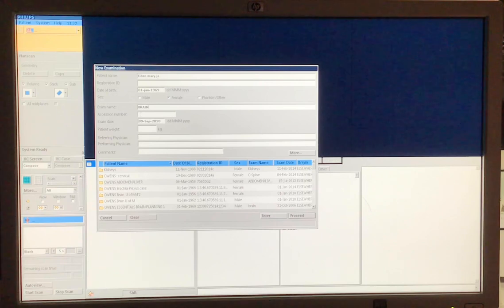The accession number will be the accession number that's tied to your exam. So again, in the real world, that will populate for you, so don't worry about that. It'll have today's date and the weight that you put in, where you're going to look at this chart. And the Phillips has it in kilograms, so therefore you're going to look at the kilograms and of course are the pounds, and you're going to correspond it to the kilograms. In lecture, remember on the very top, I was talking about the contrast. And this is the contrast that you would be using if you're going to give contrast, okay?